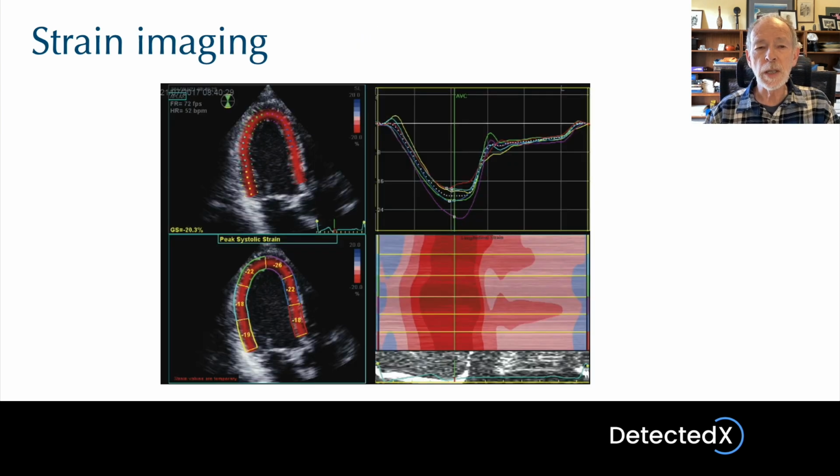The ultrasound machine can measure strain. It does this by defining two or more regions of interest. It then uses the speckle tracking technique that I've described to look at the movement of the tissue in each of the regions of interest. If the tissue is being compressed, for example, there'll be a difference in the motion in the different regions of interest. The machine will be able to look at the motion in each region of interest, work out the differential motion, and therefore calculate the strain.